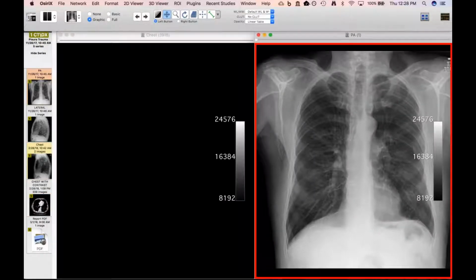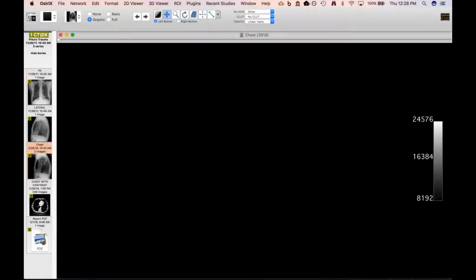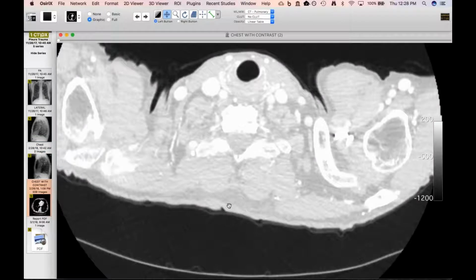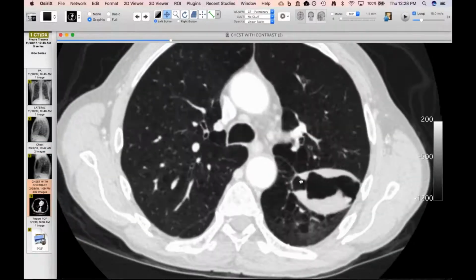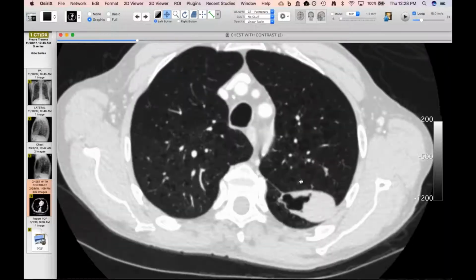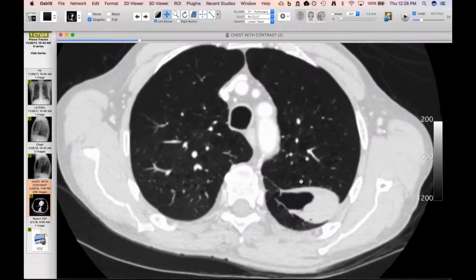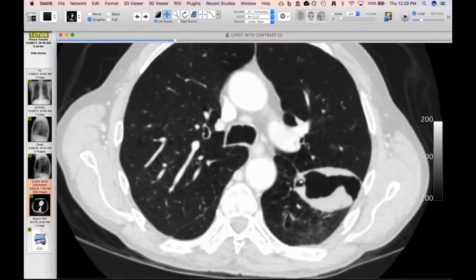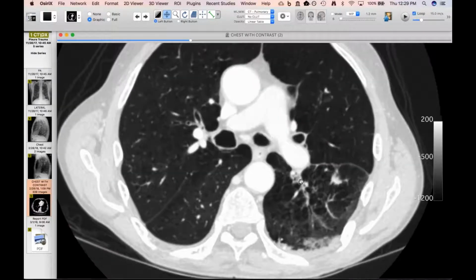What happened to that? It must be, if it wasn't there. Any other ideas? So you think that the hematoma is in the fissure? I think so. I think it is. That's what it looks like here, don't you think? Yeah, Travis. It's in the fissure. What'd you say, Jeff? I agree with you. It's pleural.